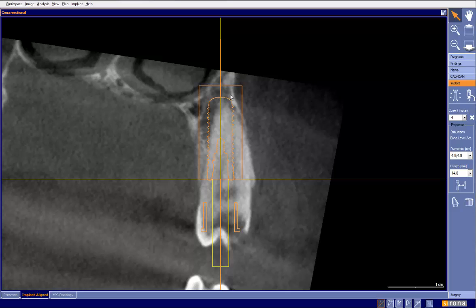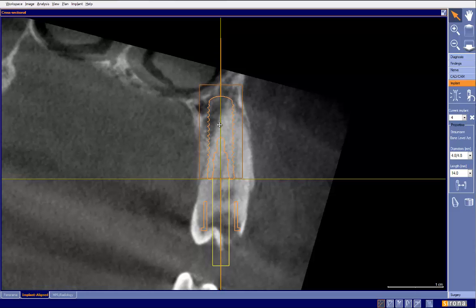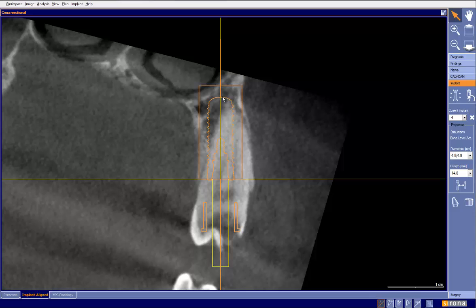We can argue about that. But these are things that we have to recognize. So then our option is, maybe I will tilt the tooth, tilt the implant like so. And now I have more space here, and now this is a lot of stability and more space. But what did this do?